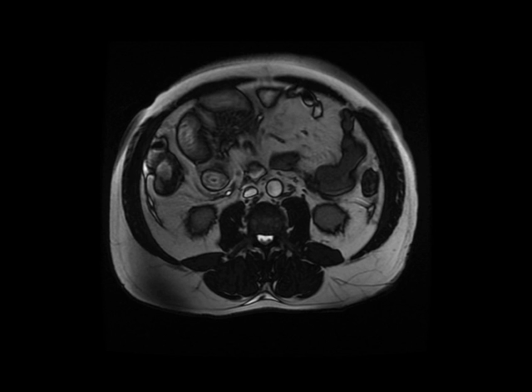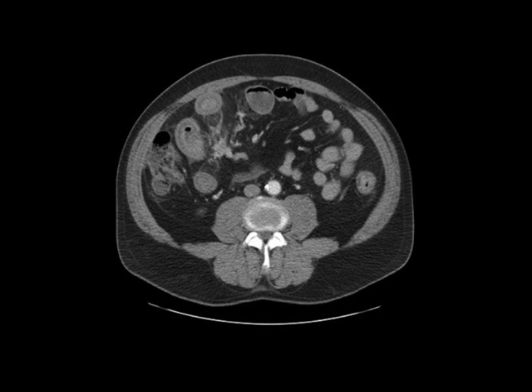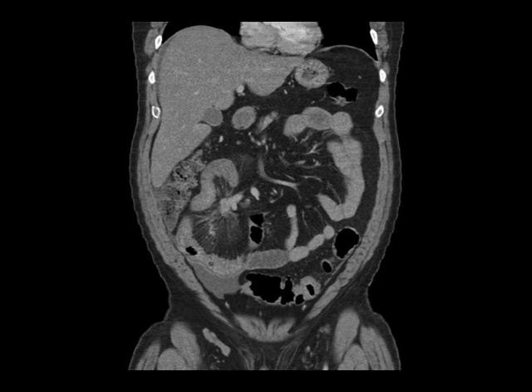Often there can be important findings, and I think all too often we're so focused in on the parenchymal organs on MR that we ignore some of these ancillary mesenteric findings. Now, if you look at these images, whether it's the T2s or the post-gadolinium images, you can see that there's an abnormal soft tissue mass in the right aspect of the mesentery. There's desmoplastic reaction. It's tethering adjacent loops of bowel, which are showing some thickening and mural edema.